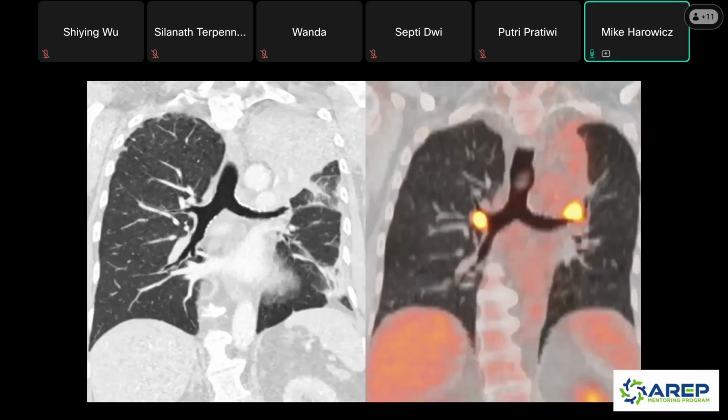Now, when we see things like that, I worry a lot about cancer, right? So to me, it's cancer until proven otherwise. Something is obstructing that airway and causing that to collapse so quickly. Now, granted, maybe the cancer was slowly growing and it finally obstructed the bronchus, but that's what I'm always most worried about. Now, other things can happen, right? You can get mucus plugging in the airways that cause things to sort of collapse a lobe, and you can get infection because of that. But cancer is always in the forefront of my mind.